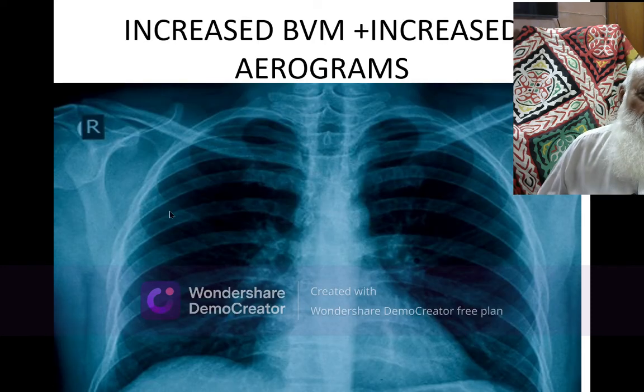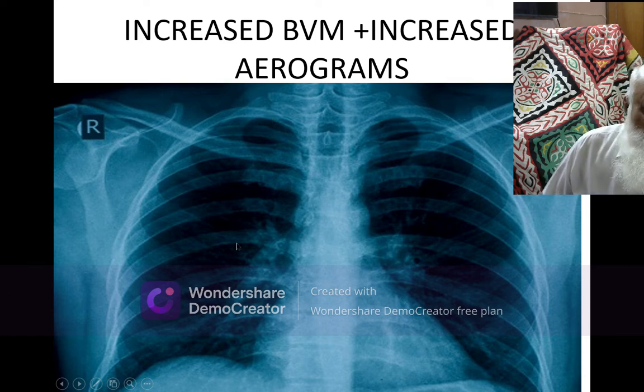Now here the first one is increased bronchovascular markings plus increased aerograms. Both are there. This is a smoker's lung. Darkening is there. Bronchovascular markings are very thick. Look at the middle zone, look at the lower zones. Normally in the lower zones there are bronchovascular markings, but normally on the right lung field, not on the left. But in this person, the bronchovascular markings are seen on the left lower zone, whereas the middle zones also have them.